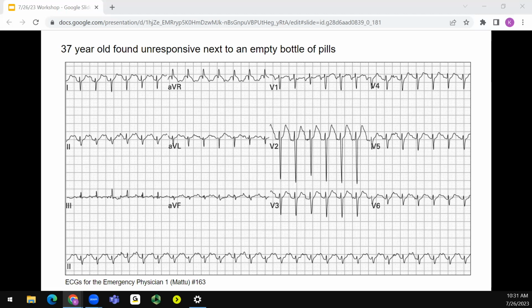Always interpret the EKG in the setting of the clinical presentation. What else should you be looking for? This is why we get EKGs in our tox patients. QTc looks okay. Someone says aVR. What's in aVR? What's a terminal R? What is a terminal R suggestive of?